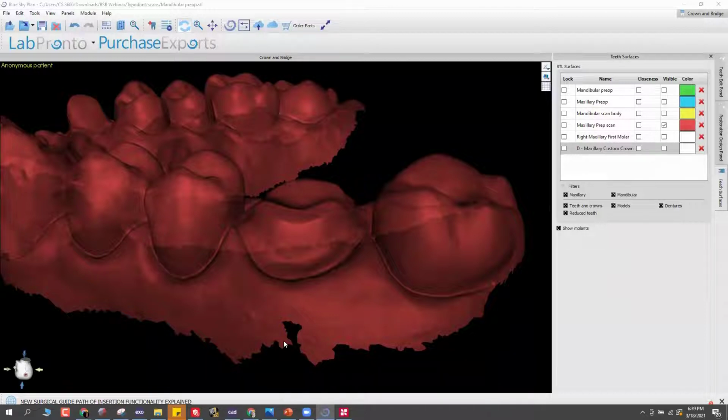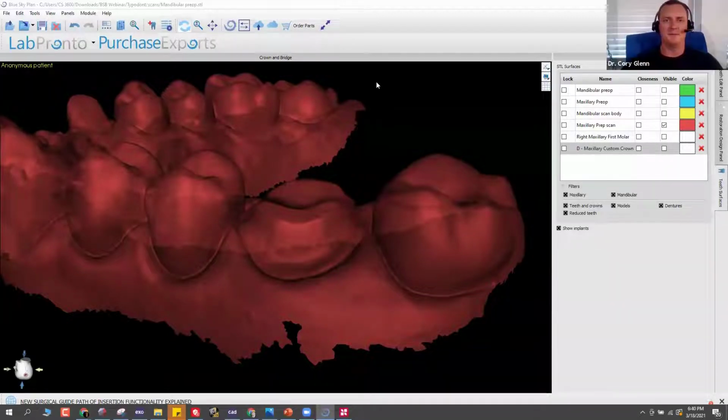It will save you processing time. Will make the software work much better. Today, STL files are quite heavy. They keep getting heavier and heavier from the intraoral scanners, from desktop scanners, same thing with CT scans. So if possible, I'd say spend a bit more, get 32 gigabytes of RAM, get an i7 processor or better, and get the dedicated RAM on the video card. That's an important point. All right, good job. That was better than my answer would have been.